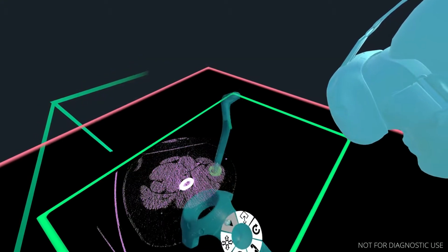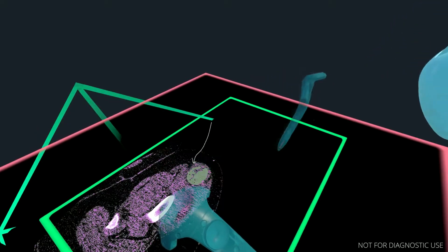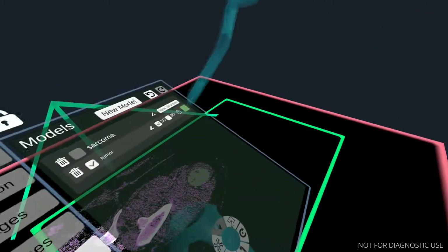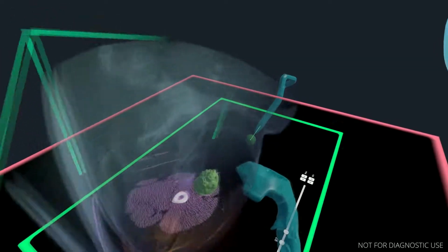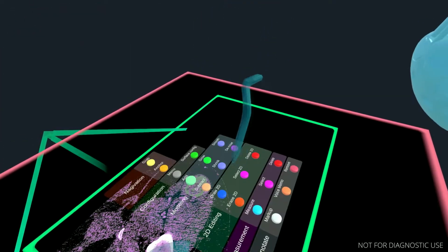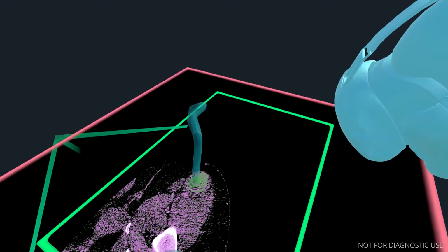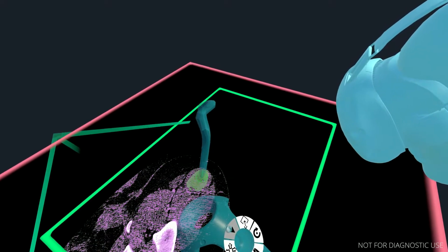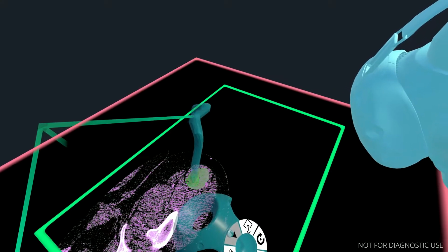And with the basic structure of, let's delete this markup here. Okay, with the basic structure there, what I can start doing, here I'll show it to you in 3D, I can start filling in some of those gaps that are there in the middle. And I'm going to do that with the grow tool, and I'll do it as I'm looking at the image here. So this is happening in 3D, even though I'm only showing a 2D representation of it. And I'm just filling in these regions.